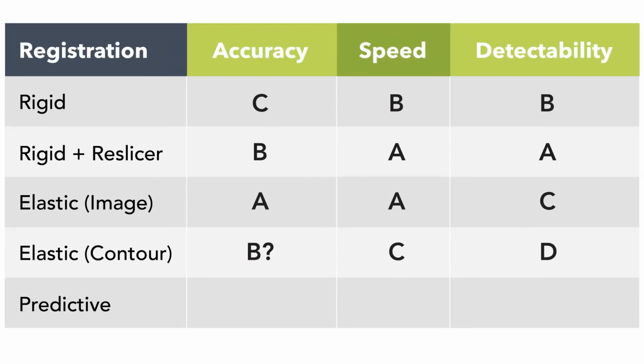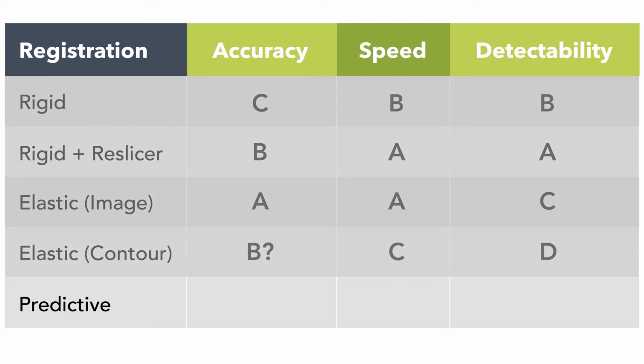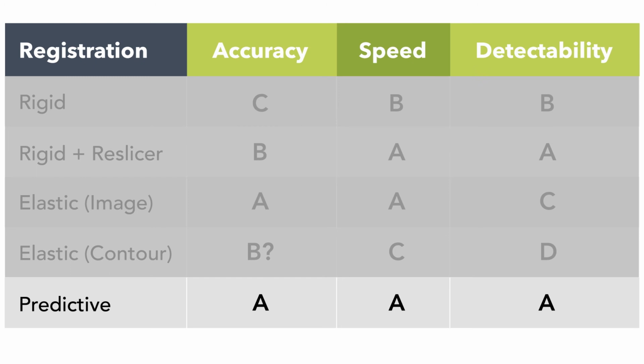And since the registration is predicted, based on the radiologist's virtual probe, the registration process is even faster than a rigid registration, typically only taking seconds. In the end, Predictive Fusion gives you a result which avoids the uncertainty of elastic registration while making errors plain, allowing you to adjust or correct before taking a biopsy or delivering treatment.